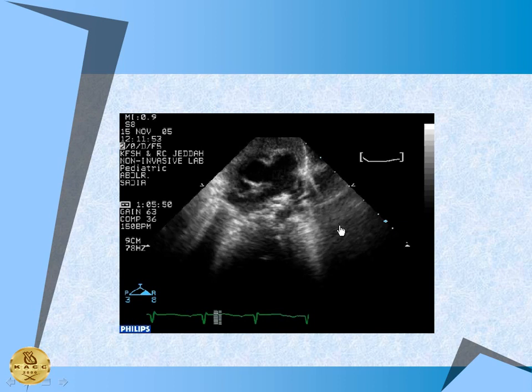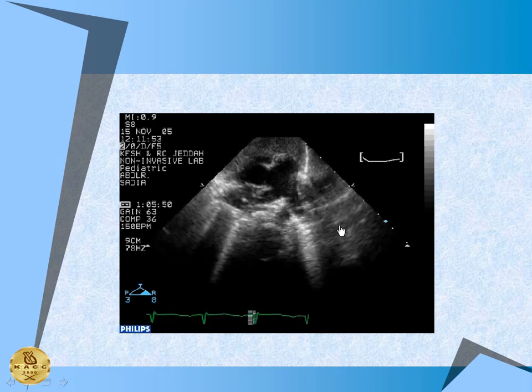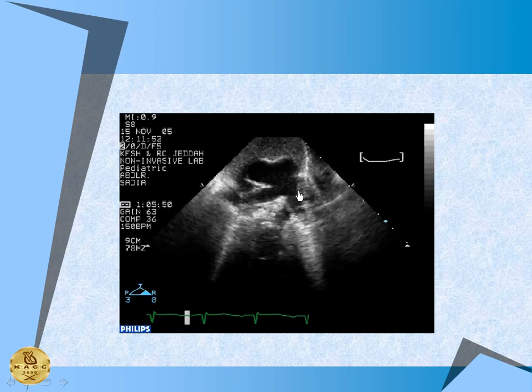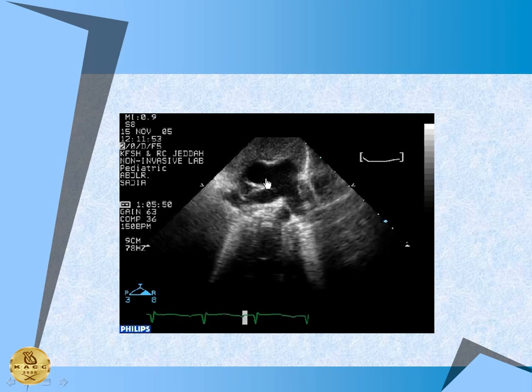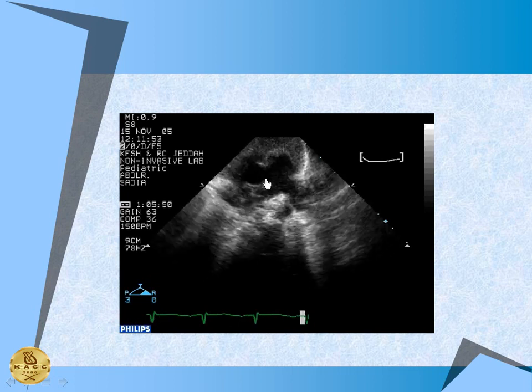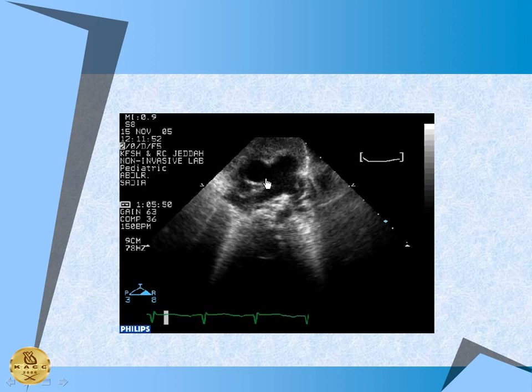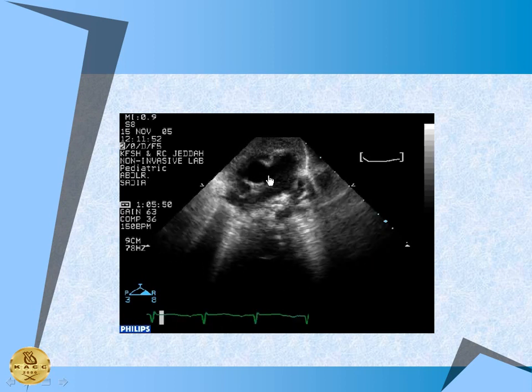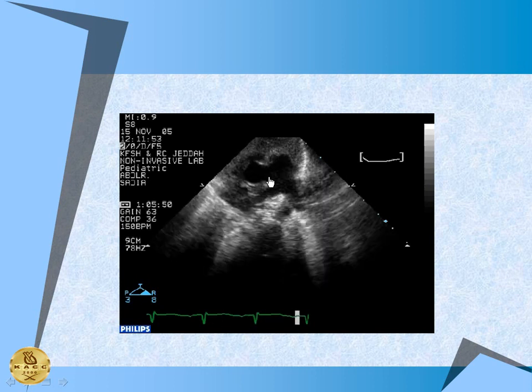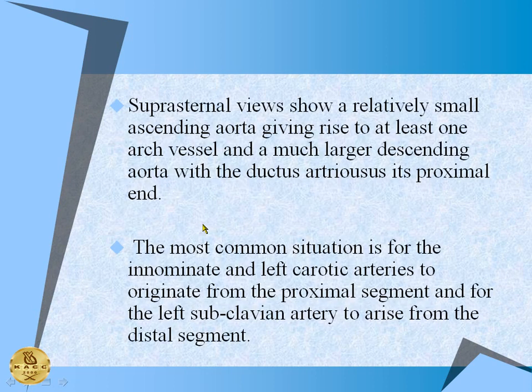This is a very rare association, but it is one of the left to right lesions that can lead to arch hypoplasia. This is a patient with AP window. And you see coarctation or left side obstructing lesions, they are commonly seen when the blood is drawn away from the LV, like in total anomalous, like in large VSDs, like in AV canal. And this is one method to take away the blood from the aorta, and you end up with an interruption.